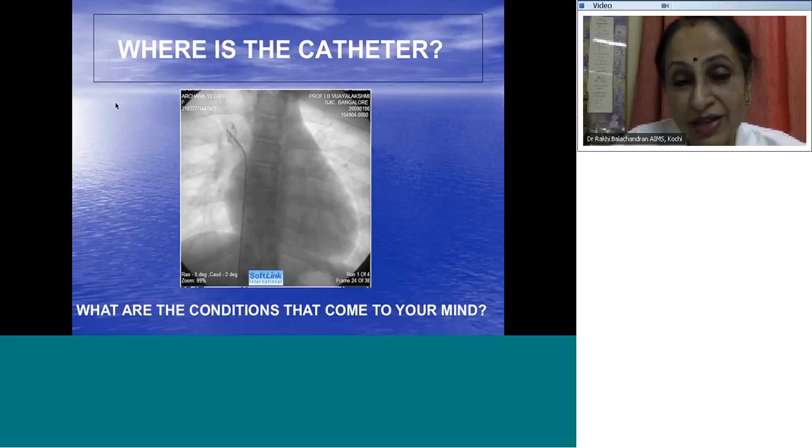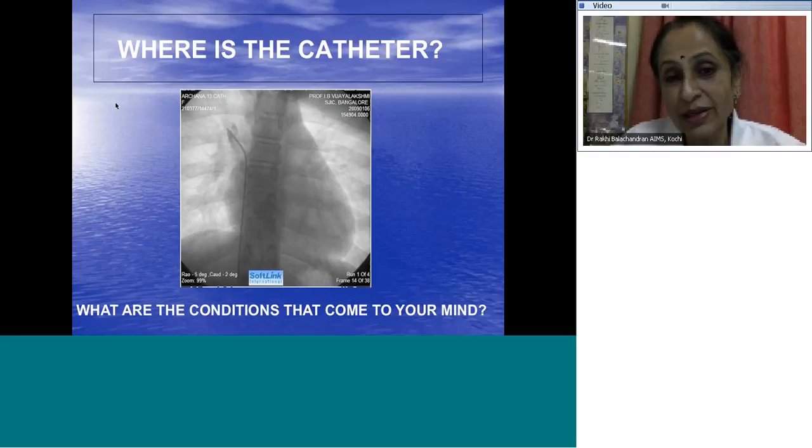So now that we have finished the X-rays and echoes, we'll move on to the angios. Now, where is the catheter? What catheter is it? And what angio is it?